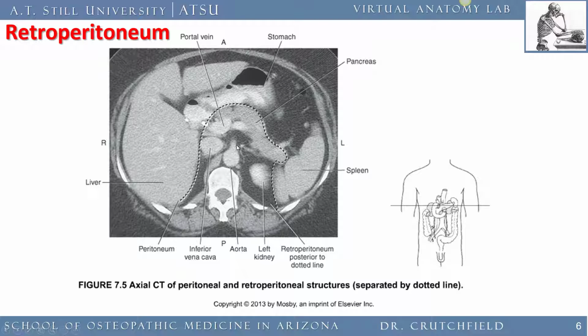And I can't tell exactly from this level, but this vessel here coming off of the aorta is probably the superior mesenteric artery. Next to the aorta, of course, is the inferior vena cava. And then we have the left kidney, which we can see here, the liver, and the falciform ligament is located here. Here's the stomach proper with an air bubble in place.